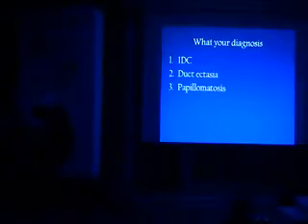We saw 1 or 2 dilated ducts in the retroareolar region. But are we talking about duct ectasia or secretory disease of the breast? Anybody with number 2? Okay. Number 3, papillomatosis. Who's with papillomatosis? No one. Okay.